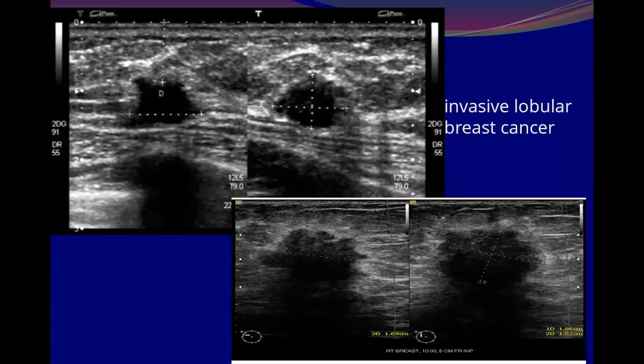Which one is a good image? Which one is the more optimized image type? Which one is more optimized? The bottom image, because it's labeled in a clock fashion.